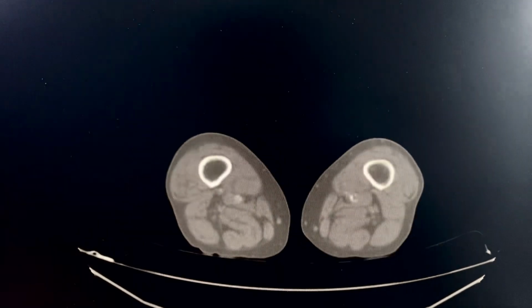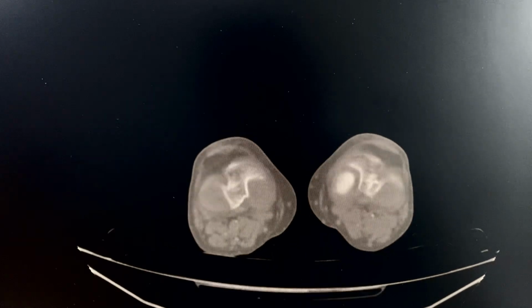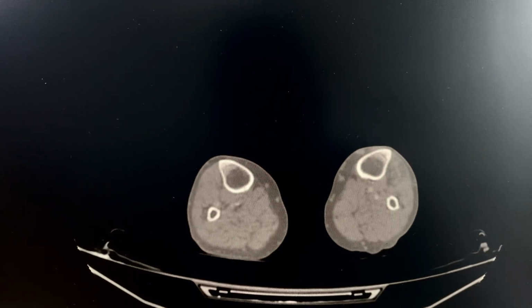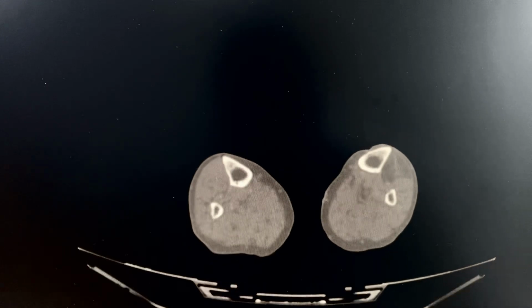Of course, now down here, then you have occlusion, right? From the popliteal artery down, you have occlusive changes there. And of course, you have your anterior tibial artery and your tibioperoneal trunk, and you have your peroneal and posterior tibial artery. They are all occluded, yes.